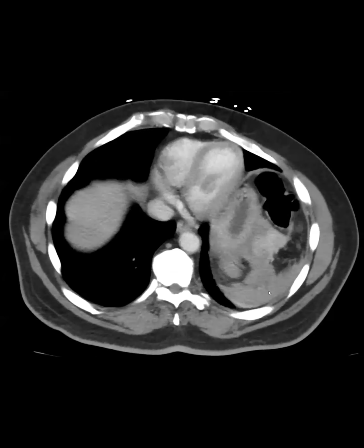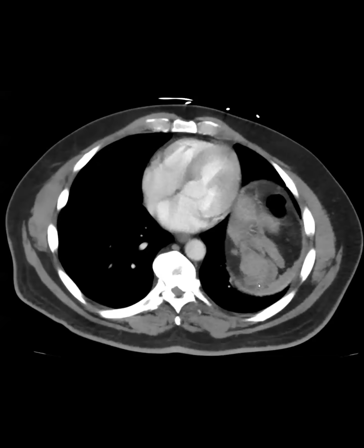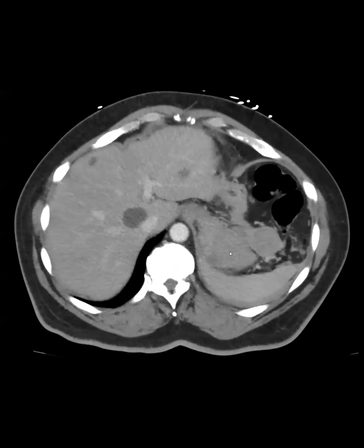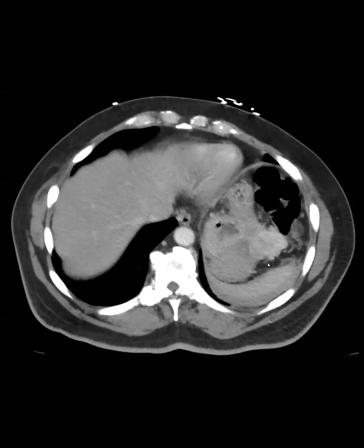Awesome. So, I'll show you an MRI, but just to point out, there are really different aspects to this thing here. This one looks heterogeneous and whorled. And then this one looks kind of heterogeneous. Both of these look like they could be blood. But then there's this dense stuff, which could look like an enhancing mass. And then you're like, is it a GIST?